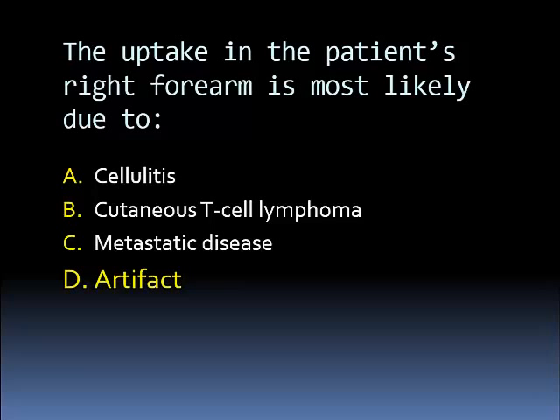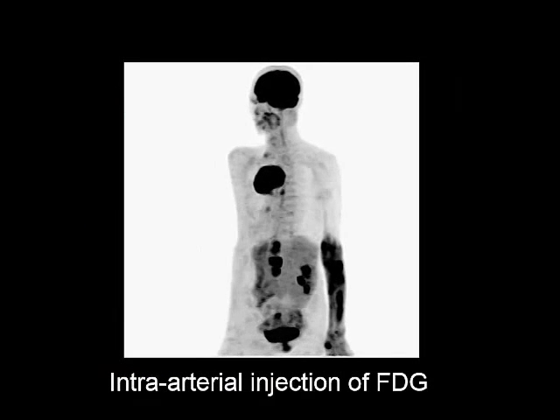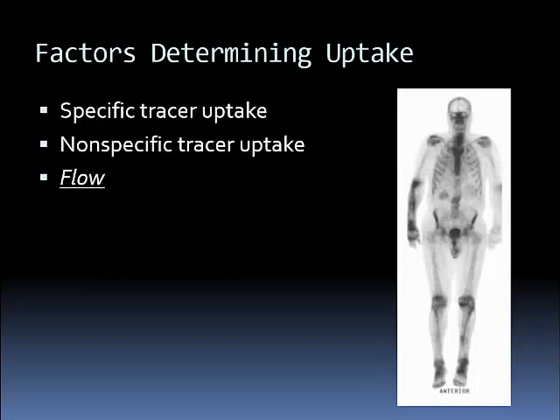Now, I'll qualify by saying that this was not a scan performed at MD Anderson Cancer Center. This was a scan performed before I arrived at MD Anderson, in my private practice in Florida. This is an intra-arterial injection of FDG. So recall that with all radiotracers, the localization method is based on several factors. We tend to think about the specific localization. In the case of FDG, we're thinking about localization and uptake by glucose transporter receptors as a marker of metabolism.